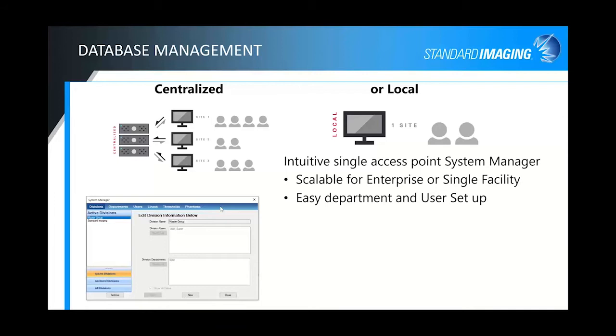Divisions are that overarching facility group, say 21st Century Oncology, or Genesis Care, or Aurora here in Wisconsin, a number of different facilities under that group. And then as far as departments go, we have the ability to set up the individual departments under that group, or again, just the individual department.